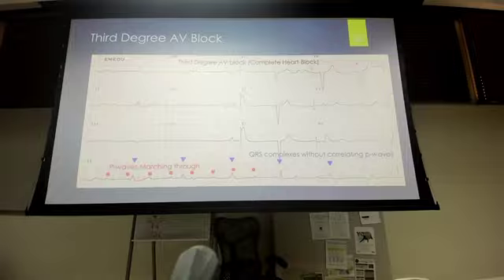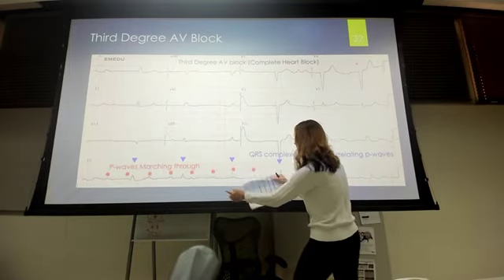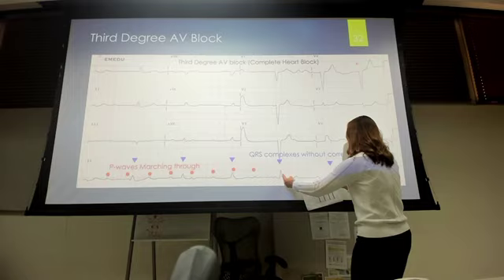So think about Wenckebach. When you measure those QRS complexes out, you take your piece of paper and put it on this R wave and the very next R wave, then move it over to the next R wave, and the next. You should eventually be like, wait, I'm supposed to have an R wave and I don't have it. If you take your paper on this and measure this out, my paper's not long enough, but this will align with this, will align with this.